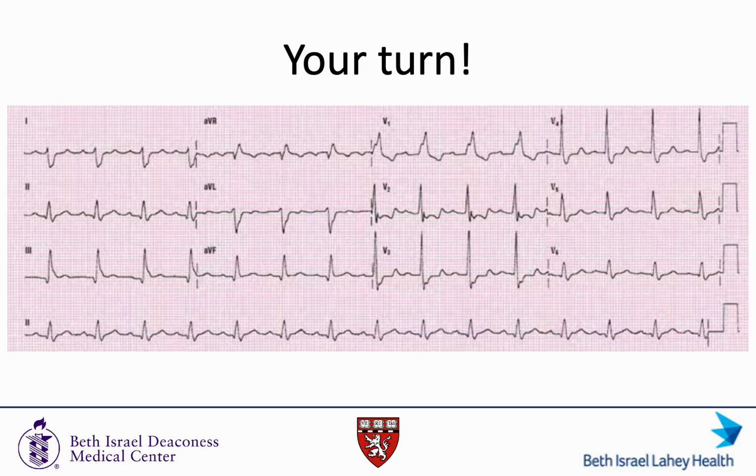Okay, now it's your turn. Pause the video and take a few minutes to go through this EKG. We'll go through it at the end of the video together as well.